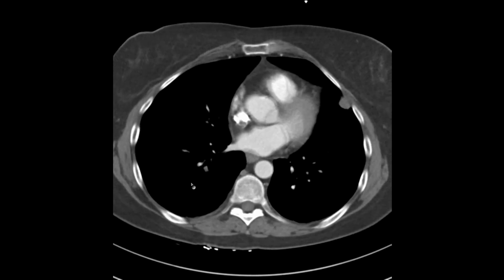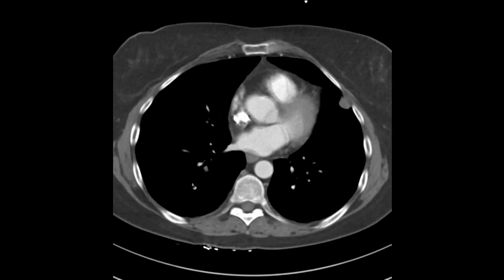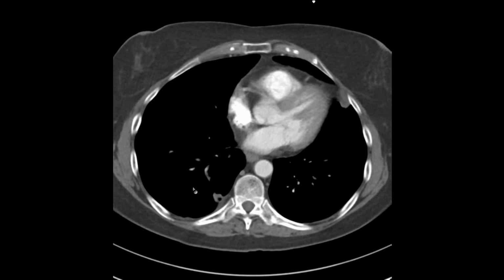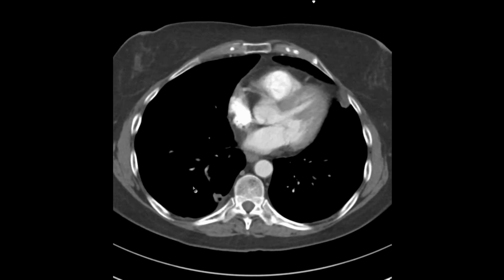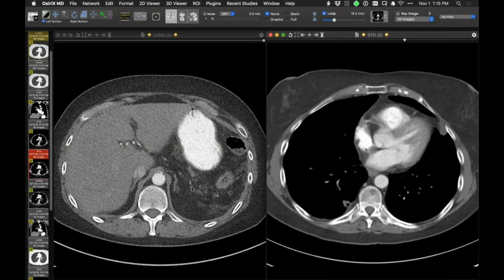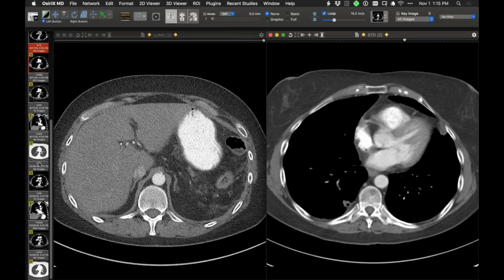So there is a vessel, clearly abnormal, and it does not opacify. And you can sort of trace that down. It now becomes gray, and we trace it down very nicely to the pulmonary infarct. So we have pulmonary infarcts. The time between the two examinations was between June 13 and August 17. So those infarcts developed between the two examinations.